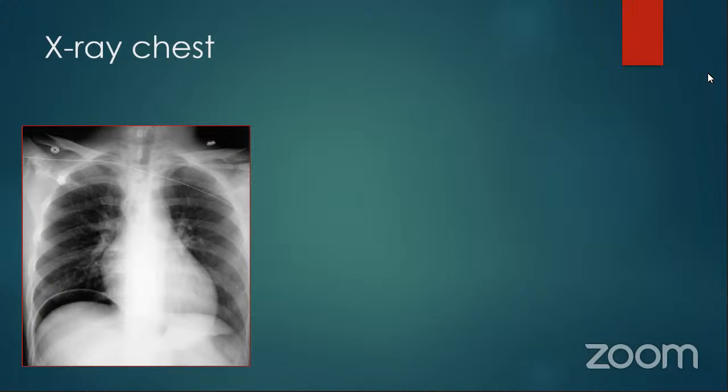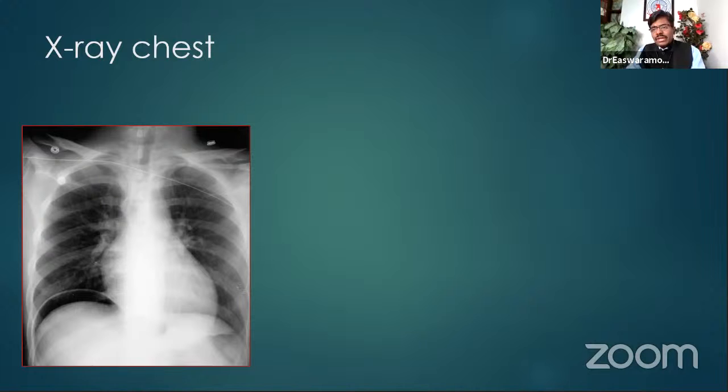Sir, I can see air under the right diaphragm, sir. Right. From what I said from the history, what did you understand? I mean, before you even started seeing the X-ray.